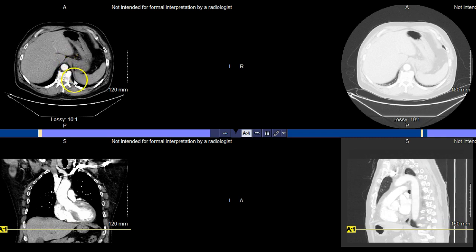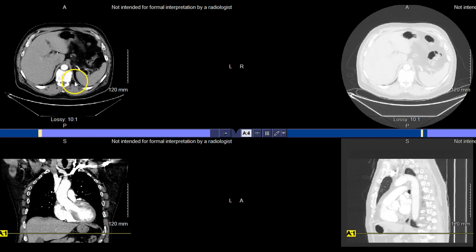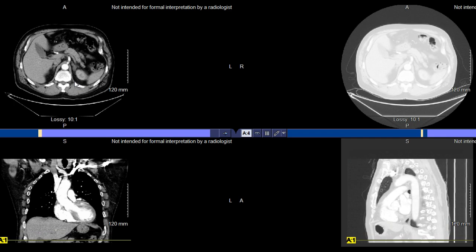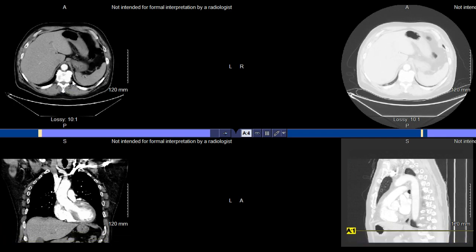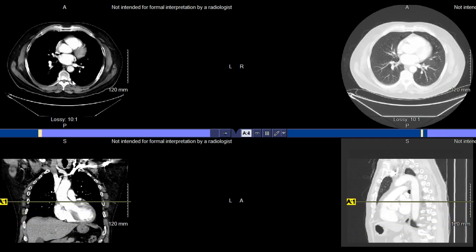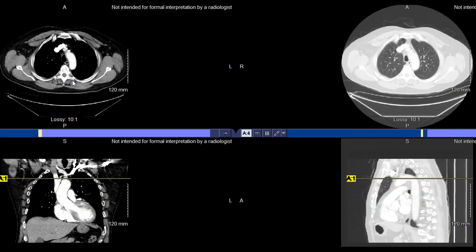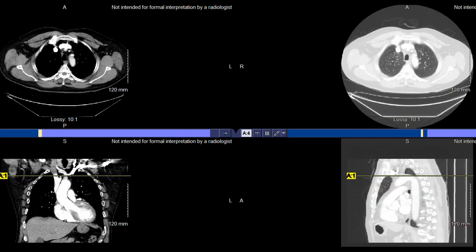So this is the diaphragm here, and you can see a little bit of the posterior lung here as well, but definitely can see the crus really, really well on both sides, contralateral, so right crus and left crus. You can see those connections there. Pretty cool visualization of those connections of the posterior region of the diaphragm, respectively. So in a nutshell, those are the structures that are associated with the heart itself. You can see where those structures are located.